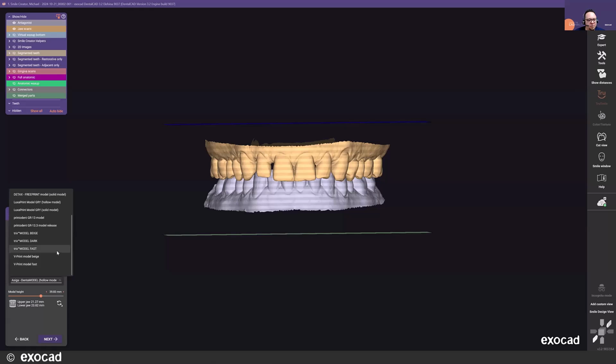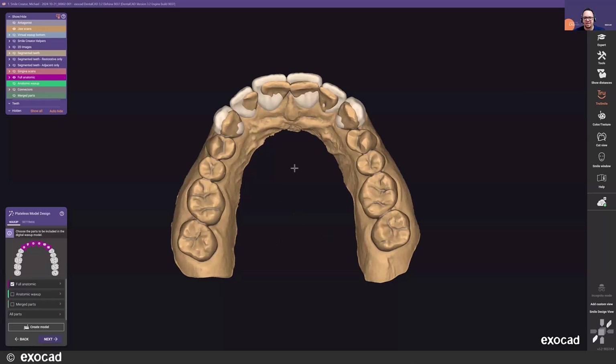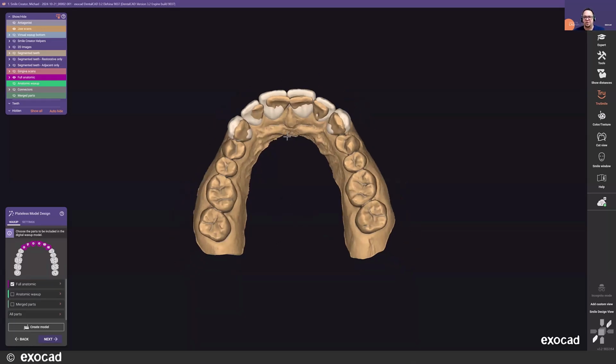So the good part about this is, with all the different manufacturers of printers out there, all these settings for presets that are created, they're created by the manufacturer. So when you select those options, you're already starting off with what the manufacturer recommends for the printer model you selected and the resin you're going to print with. Because as you all are most likely aware, depending on the printer, there may be 4 or 5 different resins available for models. So it's really awesome that those are incorporated in. That way you can ensure the final result will come out of your machine properly.